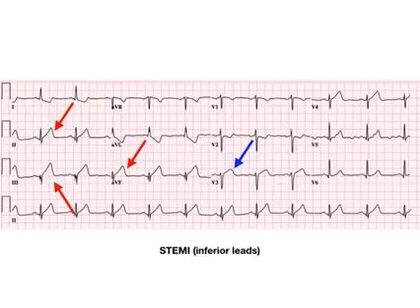Or you could just look at this and say, 2, 3, AVF have ST segment elevation. Let me compare the ST segments to the other segments. Well, none of the other ones are elevated, so this is a STEMI. Is this sinus? Not that it really matters in this question, but we look at V1 and see P waves. We look at 2 and see P waves, so it's sinus. So it's a sinus rhythm, but there's an ST segment elevated MI. Done. Answer it, check the box, move on. That's what I'm saying here. Don't go through that methodical crap unless you're going into cardiology or you really want a mastery level understanding of ECGs. If you just want to dominate boards, do it this way.